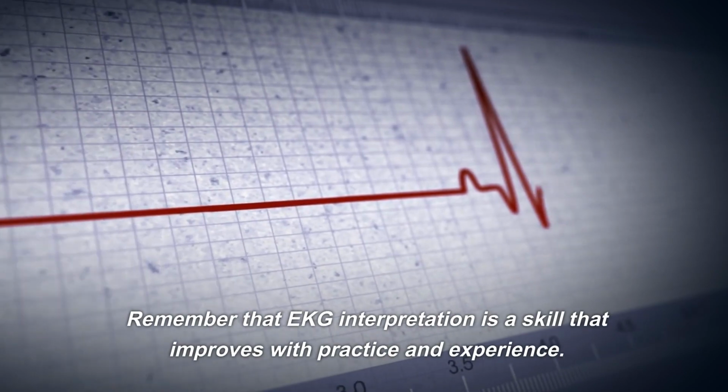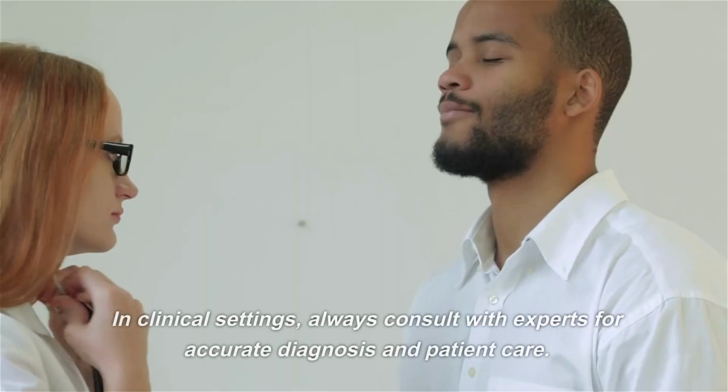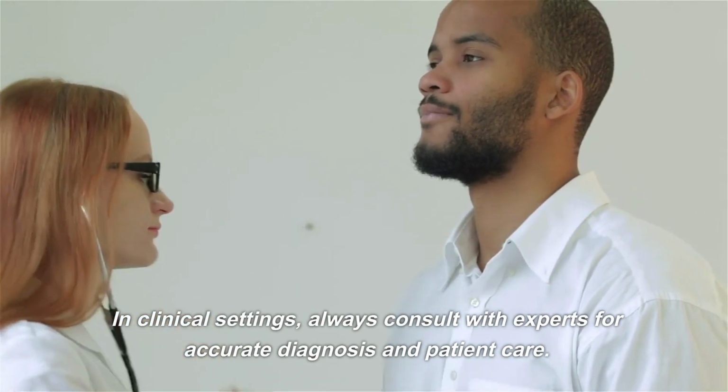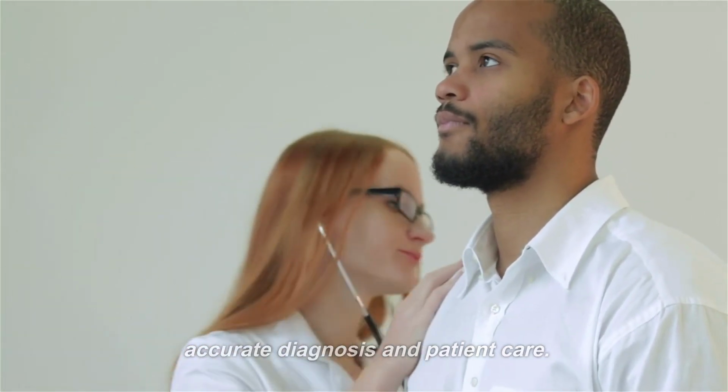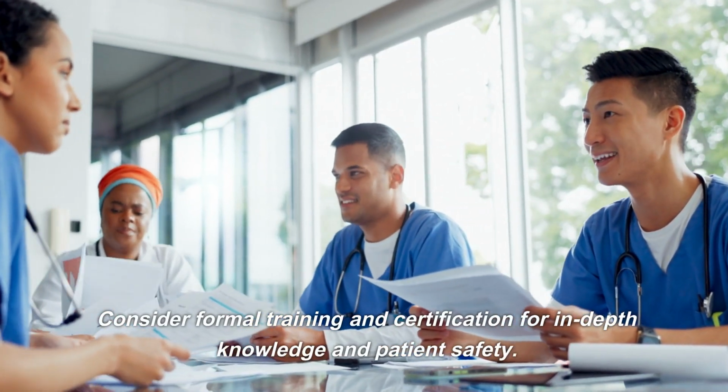Remember that EKG interpretation is a skill that improves with practice and experience. In clinical settings, always consult with experts for accurate diagnosis and patient care. Consider formal training and certification for in-depth knowledge and patient safety.